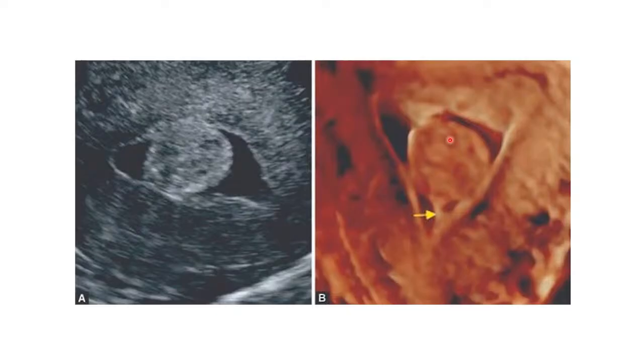So you see this type of a fibroid now, because attached by a stalk, this is a pedunculated fibroid, an intracavitary pedunculated fibroid. I said some pedunculated fibroids will attach themselves on the walls of the uterus outside, not inside. So this is an intracavitary pedunculated fibroid. But if you see such, I urge you to give a differential as well of a polyp. That can be a polypoid mass as well.